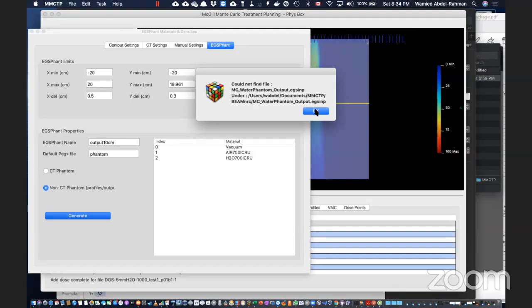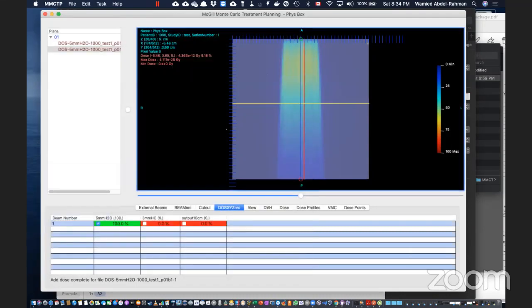So first thing is the configuration, and now we are doing some sort of proper commissioning, let's say, because of MUs and so on. I think this is a very important step. Yeah, I would agree. And then the next step, we will do a plan like what you have demonstrated to us, where we can show DVHs, and make two different calculations, one just full of water and one with heterogeneity corrections, and so on.